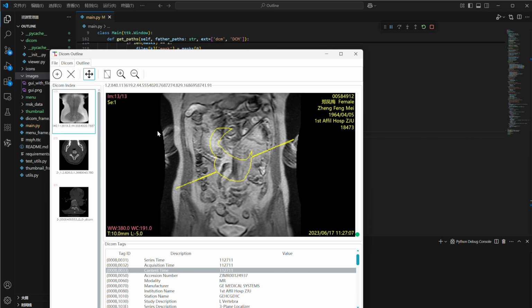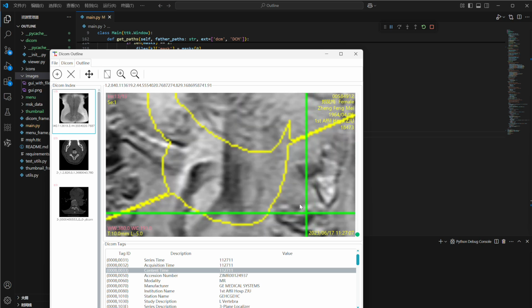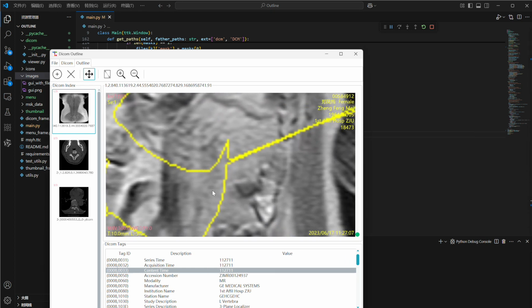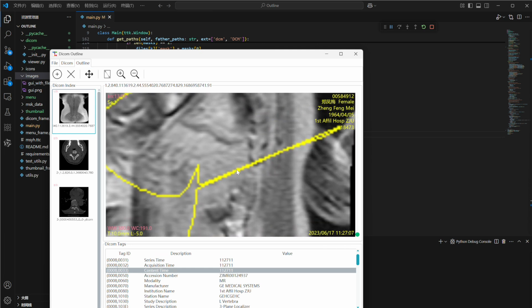The first button lets you zoom into a specific area. You can also use Alt and right-click to do this. When you hold the Alt key, a crosshair will appear to help you select precisely. Now let's go back to the third button, which is the Default Dual tool. After zooming in, you can drag the image to move your view. Alt and left-click lets you move the view more precisely.